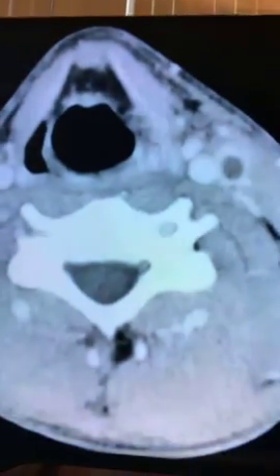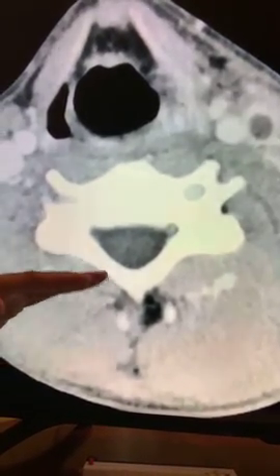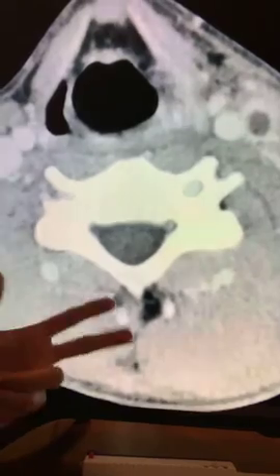Number 3, we need to figure out where in the body this actually is. That could be a little tricky if you're not familiar with looking at CT scans and you're not familiar with different types of cut, what things should look like, right? You can use little context clues though, okay? The main context clue that I want you to think about when you're looking at these exams is this vertebral body, the shape of it. We have 3 different basically types, right? Cervical, thoracic, and then lumbar. So you have to ask yourself, is this cervical, is this thoracic, or is this lumbar?